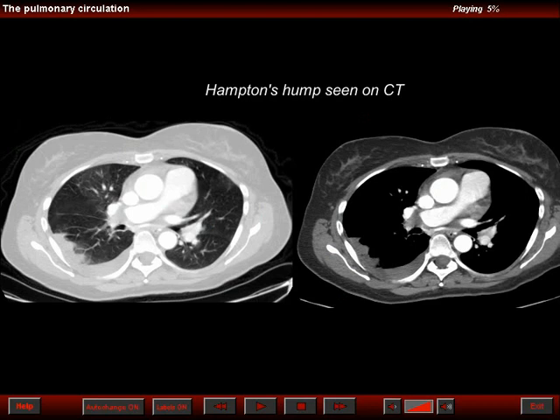Another patient where we can see the Hampton's sign of pulmonary infarction and the abrupt cutoff of vessels, something we also see associated with effusion. So we can then make a specific diagnosis of pulmonary embolism by pulmonary angiography, helical scanning, and electron beam computed tomography.